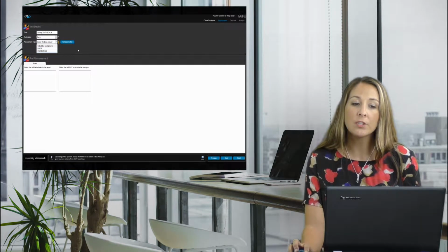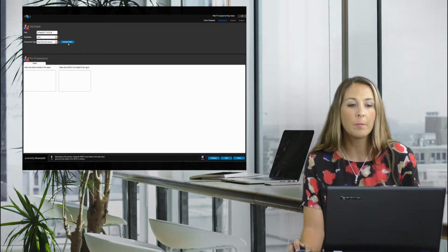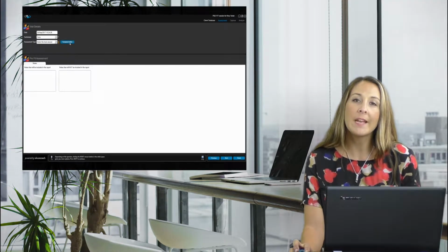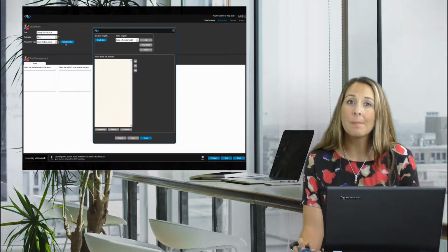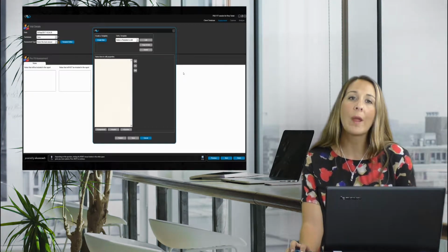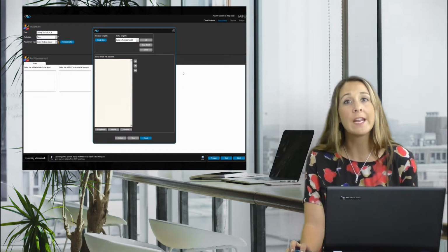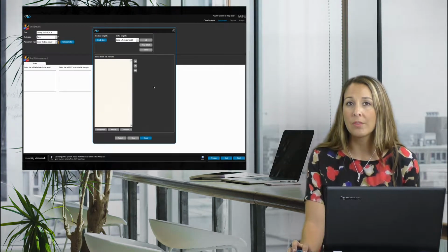Now, let's say I wanted to conduct an outcome measure that is a sit to stand, of a patient sitting to stand, and we're basically using a timed measurement. And I want every single clinician in my office to use that same template. I can actually make my own templates in our clinical movement data software. That's another one of the cool things about clinical movement data: if you want to veer away from the research-based methods, say you even want to create your own method of conducting analysis, you can make your own template within the software.